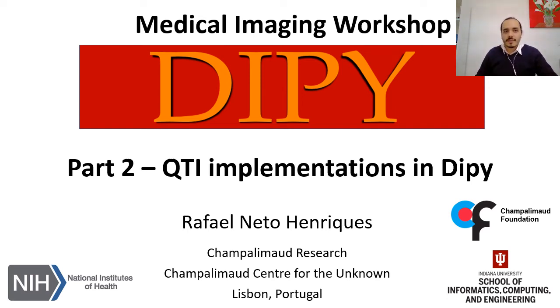Hi, welcome to the second part of the QTI lecture series. Here I will be showing a tutorial of the QTI implementations in Dipy. This tutorial will follow a similar format to my last DKI and microstructure model tutorials, so I recommend you give a look to those if you haven't yet.